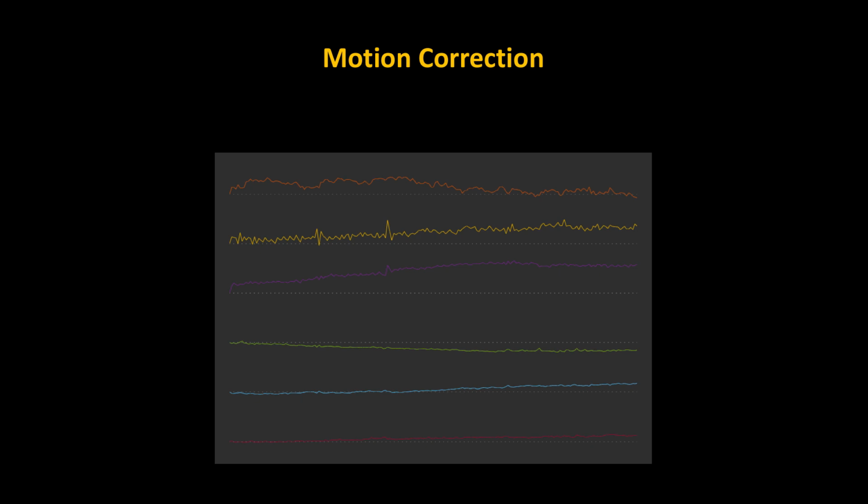An additional option, up to you, but some people like to do it, is to include the derivatives of these as well. Now, your degrees of freedom are limited by your effective number of time points, so the number of time points accounted for temporal smoothing. And usually you have more than enough to account for things like this. So if you want to include derivatives, I recommend doing it. I don't see a huge downside to doing it. And it doesn't seem to be correlated with any of the resting state signal that you're interested in. Well, if it is, you're trying to remove anything related to motion.